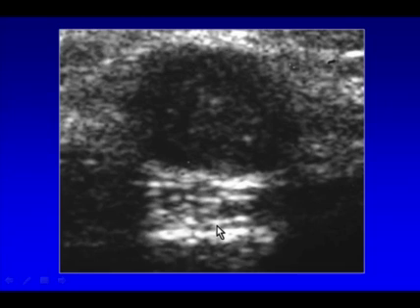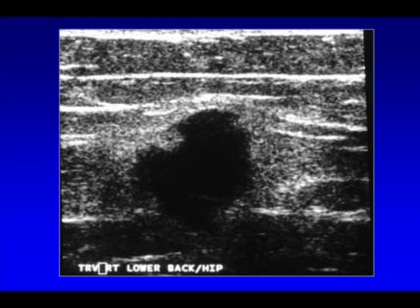In fact, when we studied the ultrasound appearance of melanomas, we published a series in which 72% of metastatic melanomas in the soft tissues had increased acoustic through transmission. It is simply an unhelpful sign.